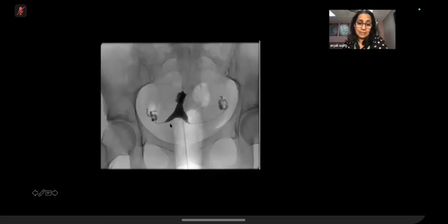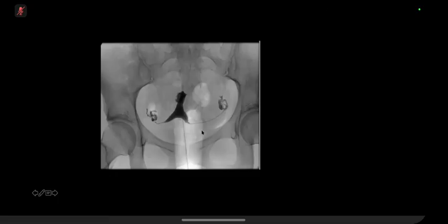This is an inverted negative image of a hysterosalpingogram. What do you think is happening? You've got, I think, probably an anteverted, anteflexed uterus that is almost normal, but just a little bit more emphasized. So potentially an arcuate uterus.